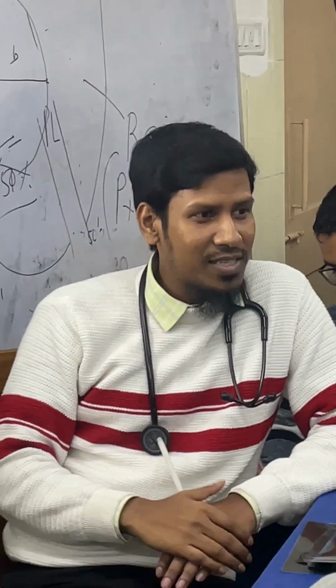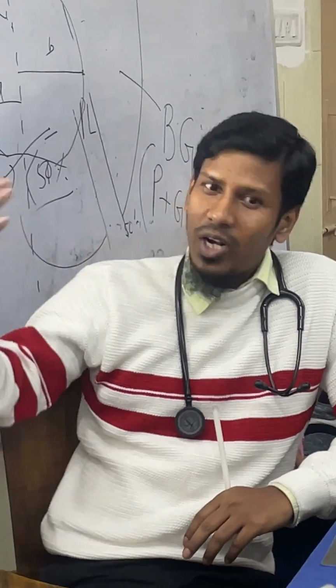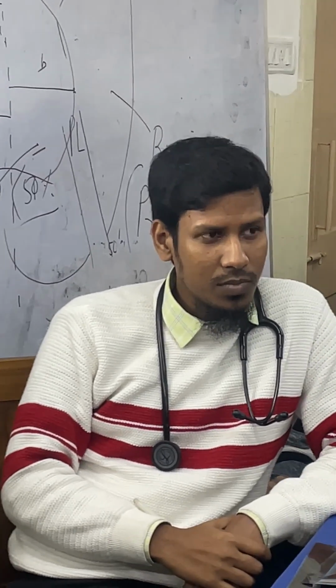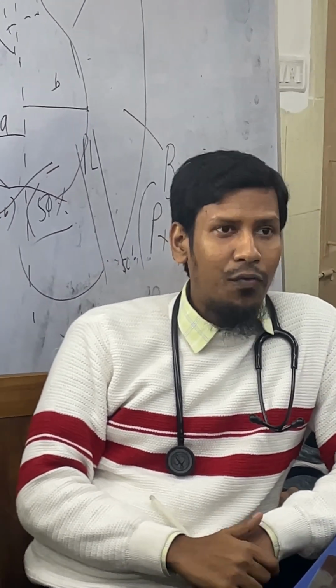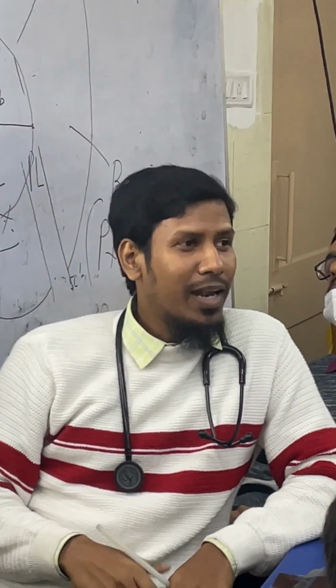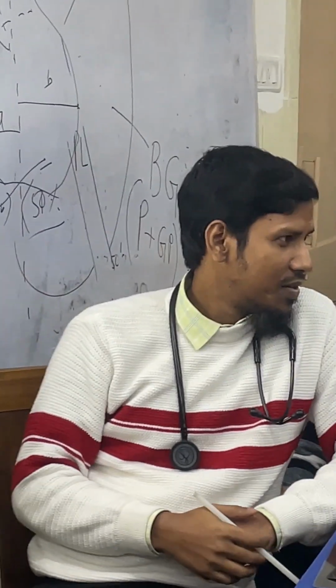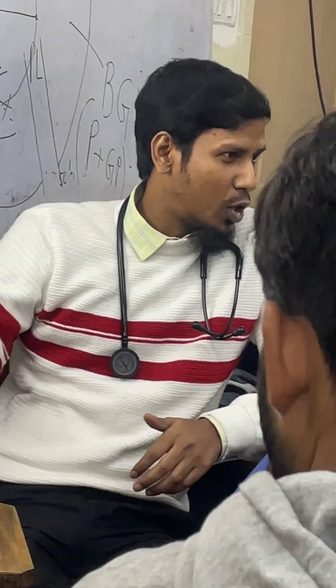So diaphragm examination will tell the pathology above the diaphragm and below the diaphragm. Food intake, of course, but the intestine everywhere having food, there will be some part with air at least. So that is more suggestive. And in a surgical emergency patient, you can also get an air fluid level in the abdominal part by seeing the diaphragm.